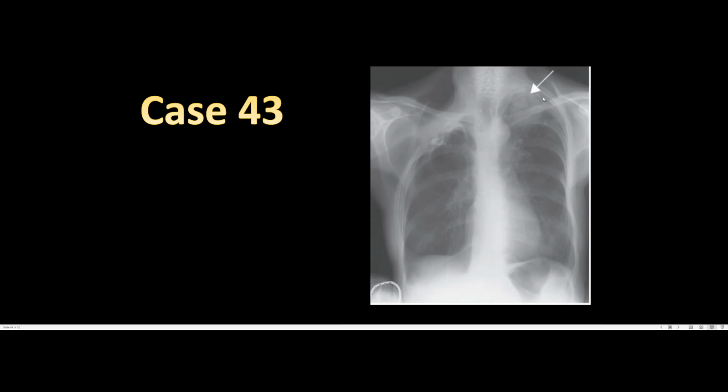This could be Pancoast tumor, this could be a case of latent TB, this could be a case of aspergillosis. This could be a whole bunch of things. Again, the patient history will tell you the diagnosis. Maybe this is Pancoast tumor, maybe something else.